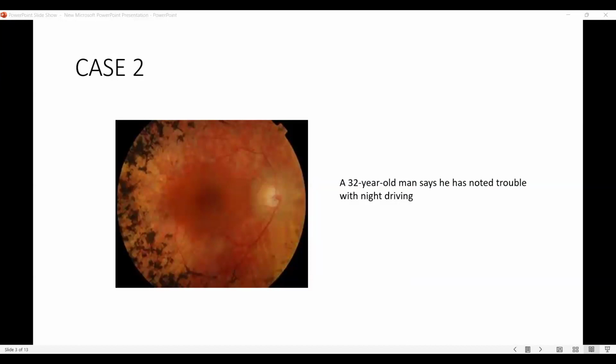This is a fundus photograph of the right eye, centered on the disc and macula, showing clear media. Vertical cup disc ratio of 0.7:1. Vessels appear slightly nasalized, and there is some background disturbance. There is slight nasalization of the vessels, but arterioles appear thinner than normal. And there are multiple bony spicules in the mid periphery, and the foveal reflex appears dull.